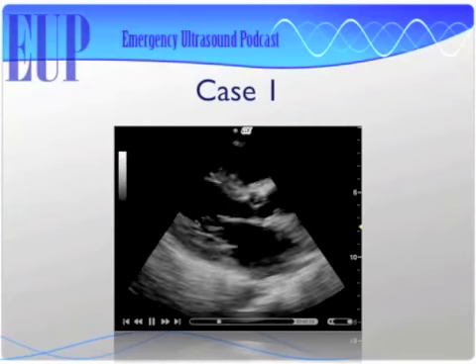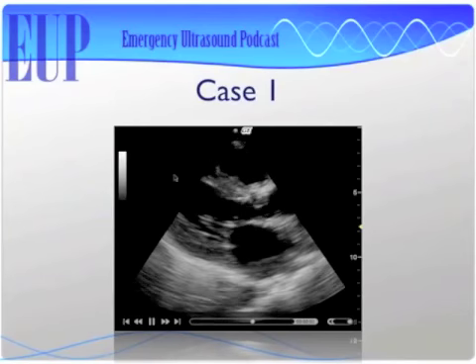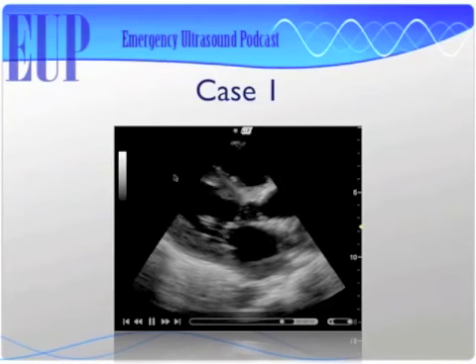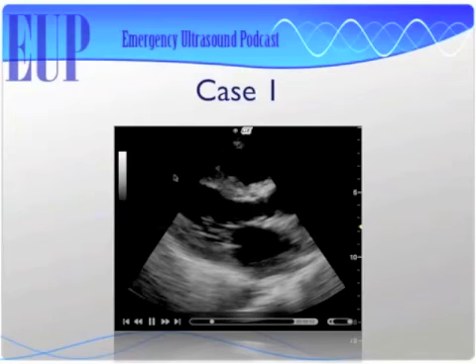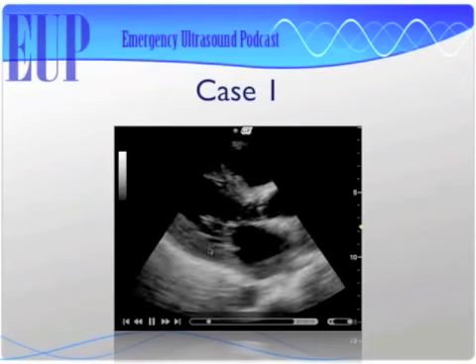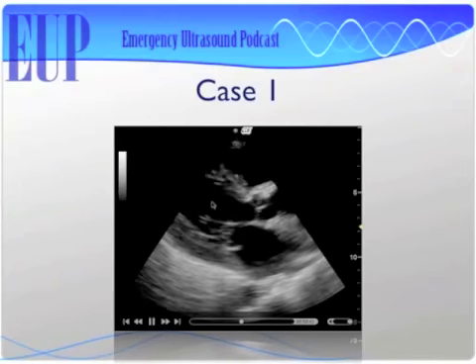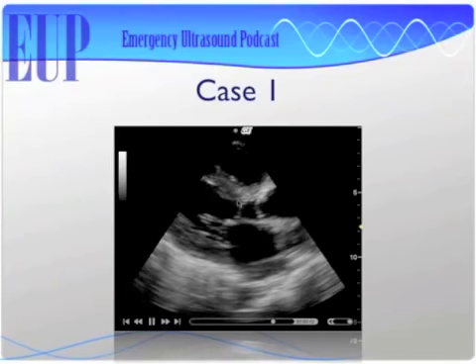Can we look at this left ventricle and say one portion of it seems to be squeezing less than another portion? I think yes. That portion on the back side at the bottom of the screen. Okay, down at the bottom of the screen. The green part. I'm not sure that was actually green, but maybe it was greenish yellow. Okay, great. So you're telling me the septum looks good. Septum, LAD distribution looks pretty good.